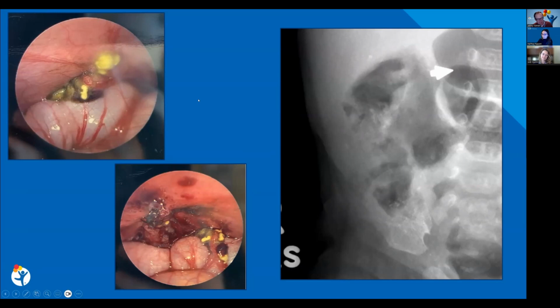So this ended up being a case of meconium peritonitis, where we happened to see some of those calcified things on our ultrasound. It is theorized that these patients have an in utero perforation and have that spillage of meconium, which then subsequently sealed itself off. So again, this was just a very odd case. I wasn't sure what to make of it prospectively, but it ended up being meconium that made its way down into that hernia sac in the inguinal canal.